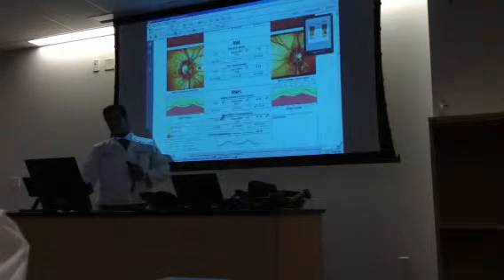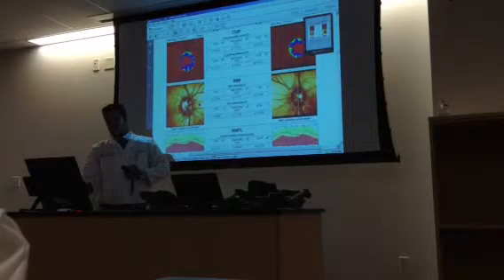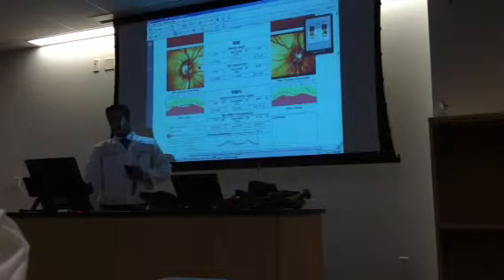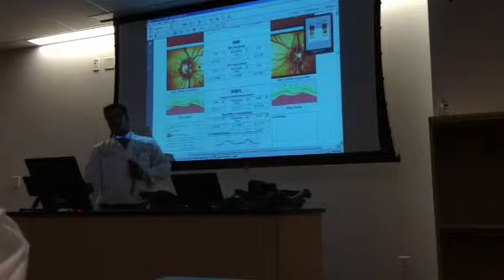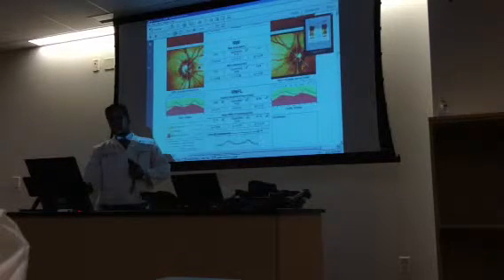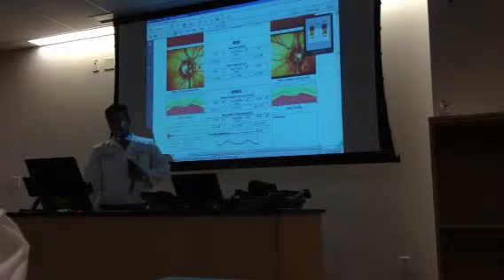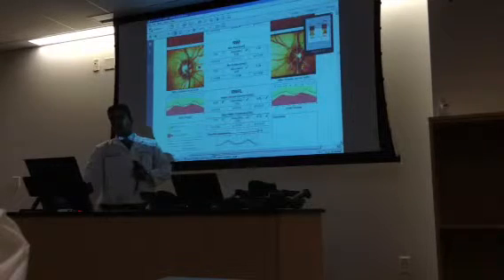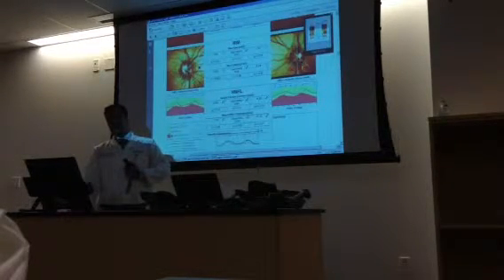Height variation contour is the value that is labeled in nerve fiber layer, but it's actually the representation of the rim tissue thickness as a function of 360-degree plot around the disc. And height variation contour is one value that says if the rim tissue is good or not.